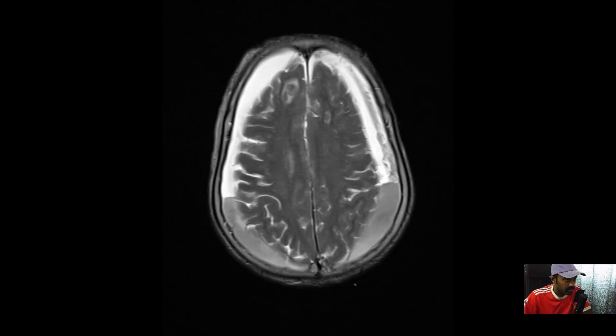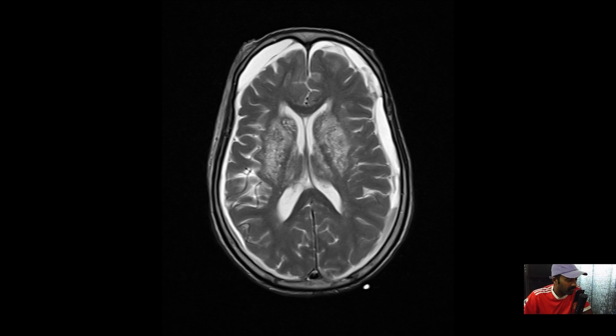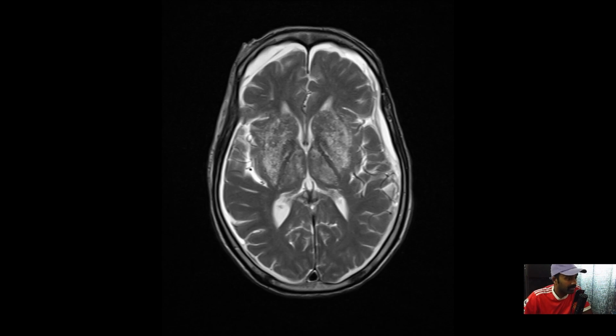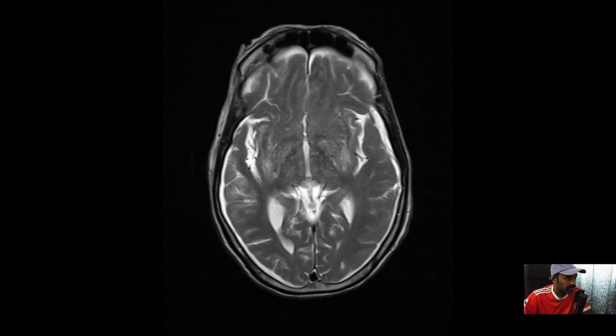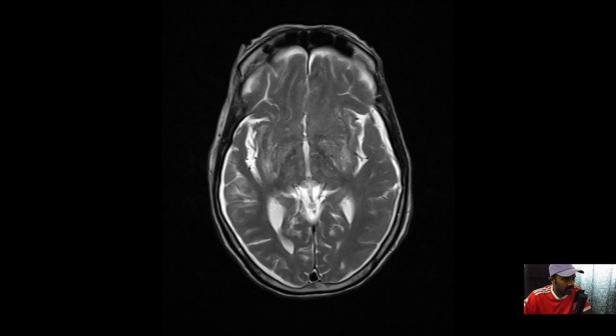There also appears to be some parenchymal foci of bleed in the frontal lobes. A cribriform appearance of bilateral basal ganglia and thalami due to diffuse generalized enlarged perivascular spaces, Virchow-Robin spaces, typically associated with chronic severe small vessel disease, and also associations with vascular dementia, Alzheimer, Parkinsonism, etc.